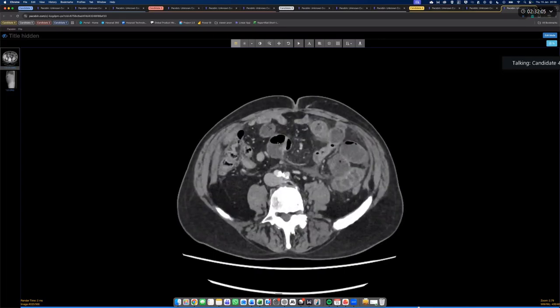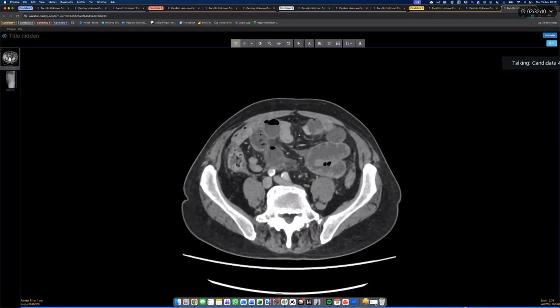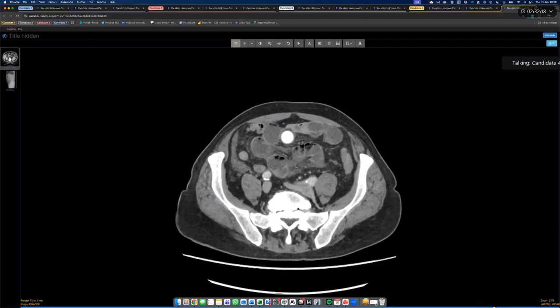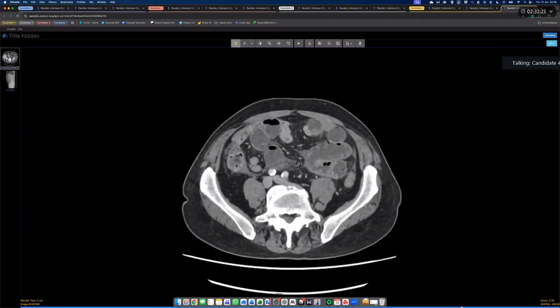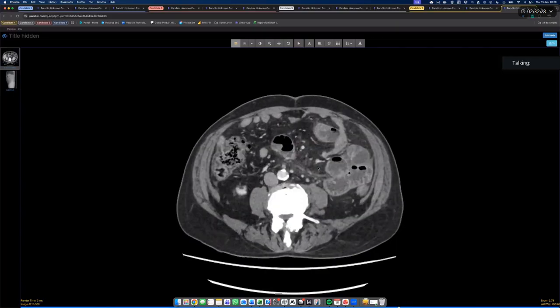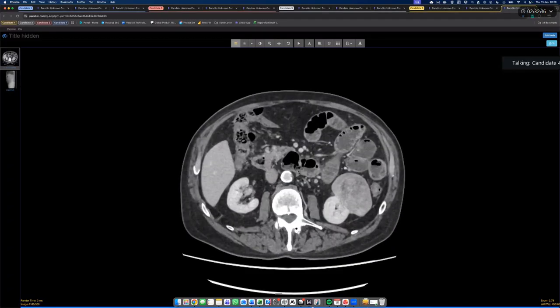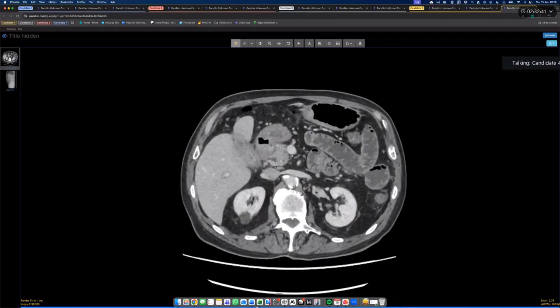And the bowel loops proximal to this area appear to be dilated. And there's free fluid also present, and these bowel loops are small bowel loops. They are dilated, and so the jejunal loops also appear to be dilated. And I could find a lesion in the left kidney, but I will come back to this lesion.